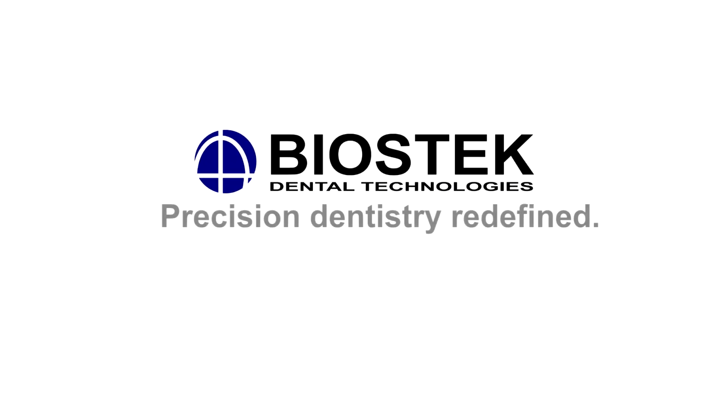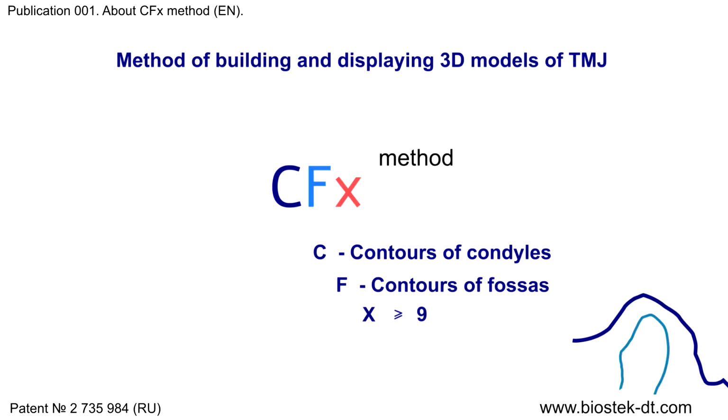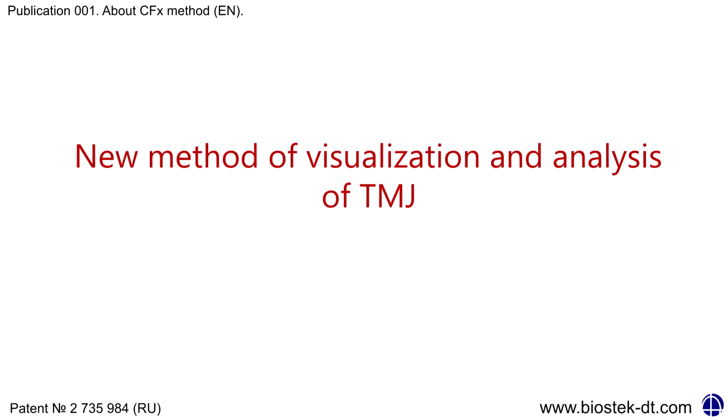Biostek Dental Technologies, Precision Dentistry Redefined. CFX method of building and displaying computer 3D models of temporomandibular joints, TMJ. New method of visualization and analysis of TMJ.